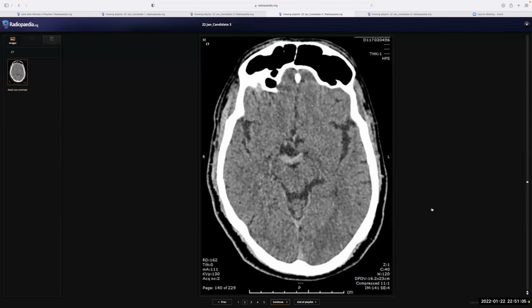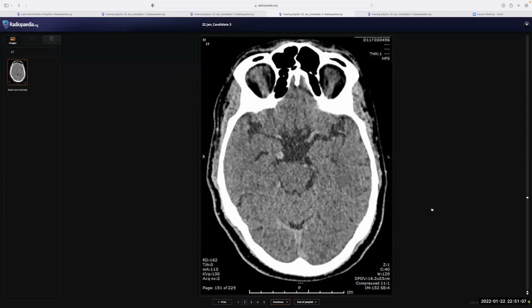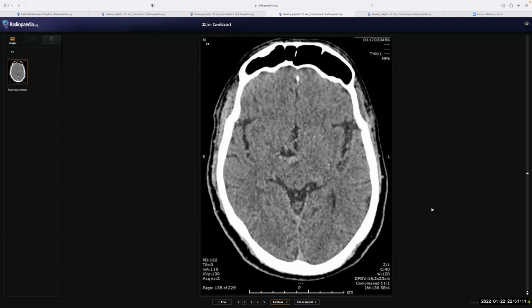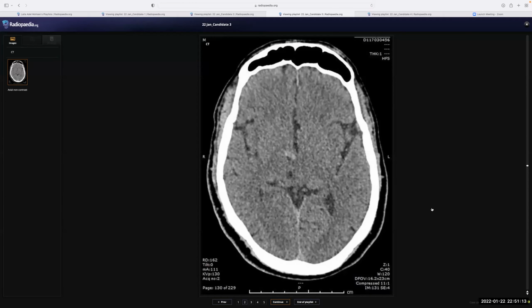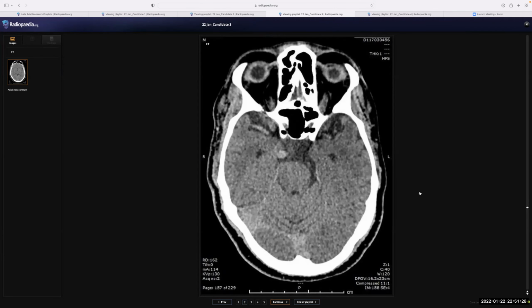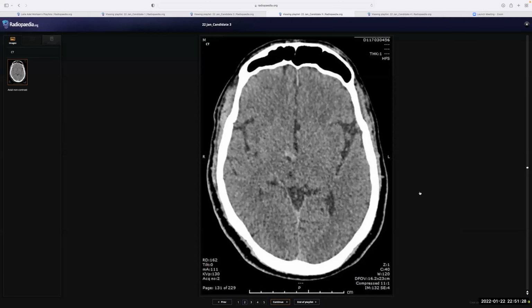Looking at the cerebrum, if there is any mass lesion in the cerebrum. At the circle of Willis, I couldn't see any aneurysm. However, there is some hyperdensity in the region of the internal carotid, I think, yes. No, this is not intracarotid, this is in the basal, yeah.